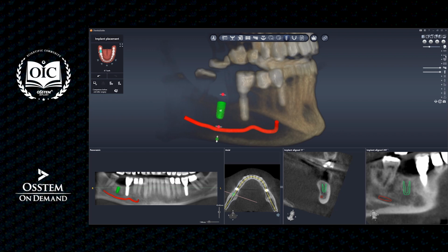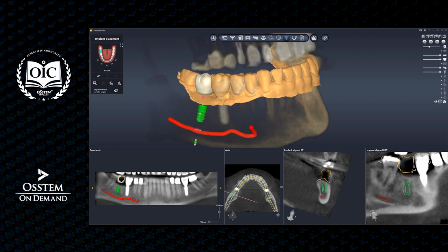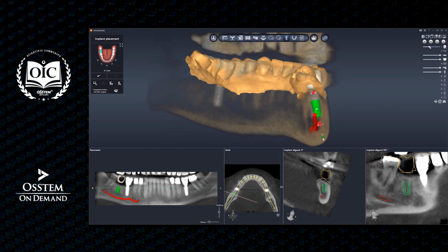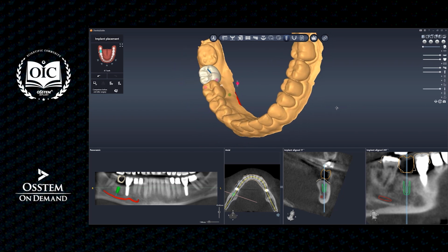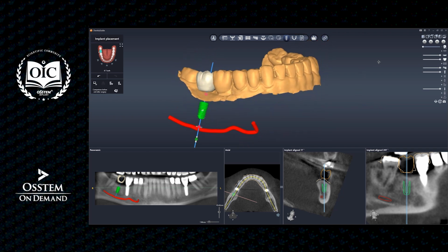If we have the shape, the size, the position of the soft tissue from intraoral scanner, it's better because we can calculate with the measurements how much here. But then if we have the wax-up, we can also make the proper angulation of the implant. However, the best is when we have the prosthetic component, and it would be shown in a moment.